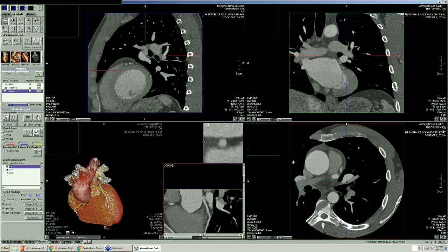And so we can measure this all the time. We can just keep measuring and seeing what size we can get in different views. It's supposed to be somewhat tangential and perpendicular to a tangent. And the tangent would be something coming along like that, and something coming along like this with a 90-degree angle.